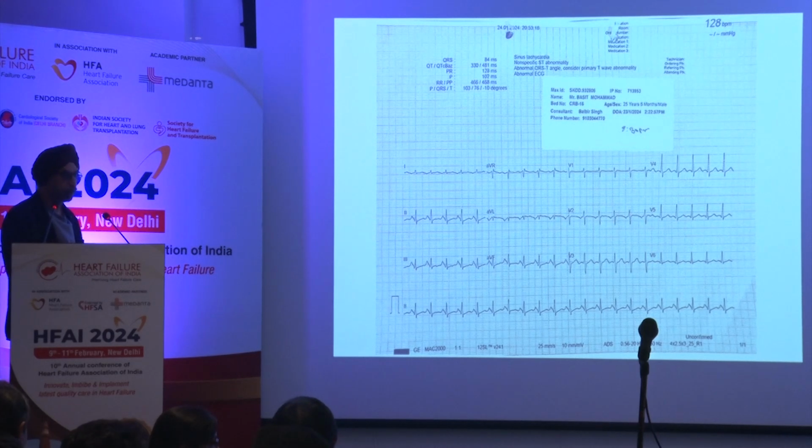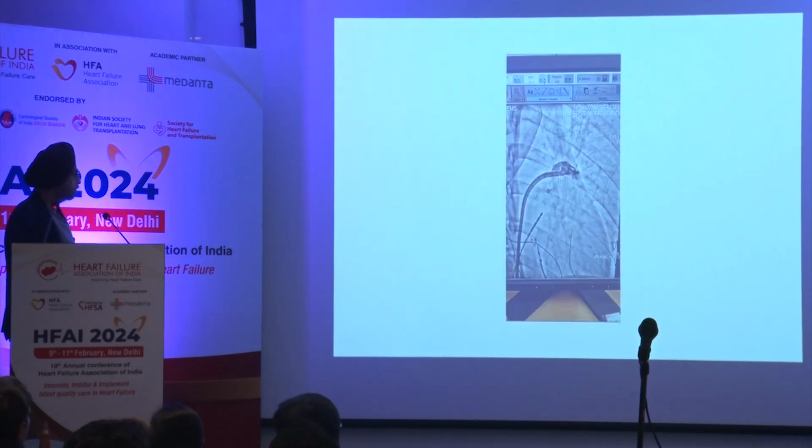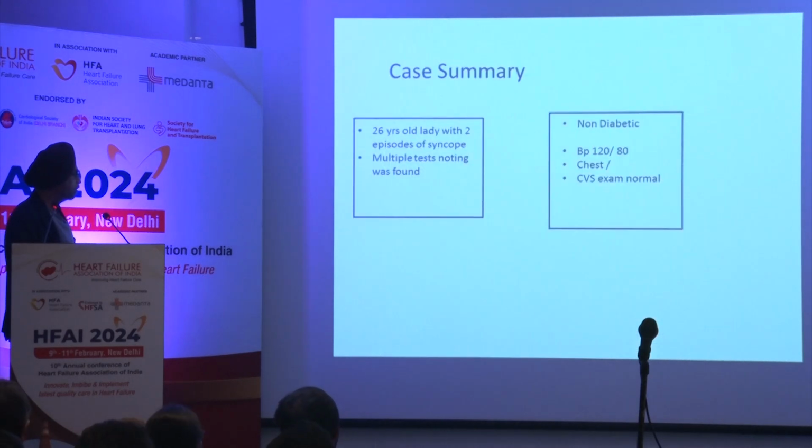Balbir, they want us to close. Probably the last ECG we can do. Okay, let's look at this important ECG.